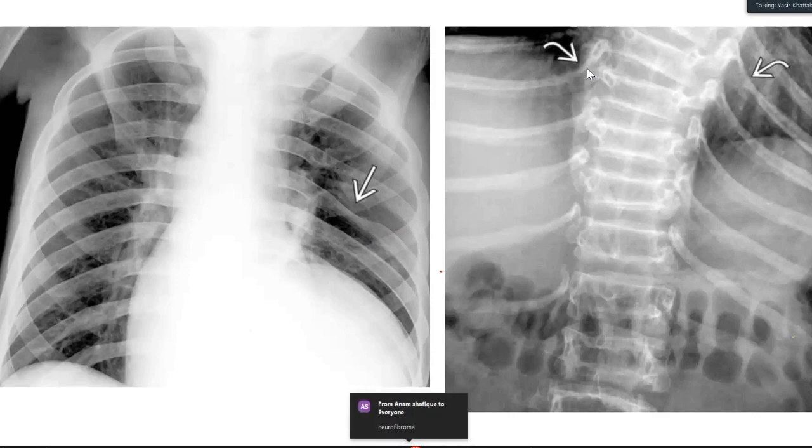This is a cone down radiograph, and this is a patient with osteogenesis imperfecta. And you see the ribs are gracile, they are thinned, flattened, narrowed posteriorly. So sometimes other associated abnormalities can lead to rib abnormalities, not necessarily because of the localized.